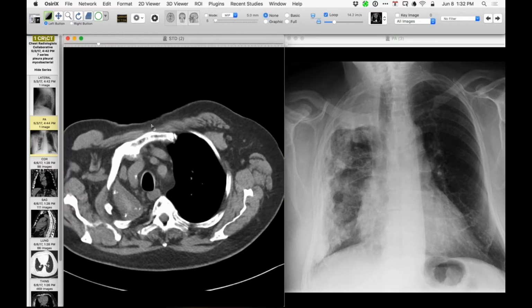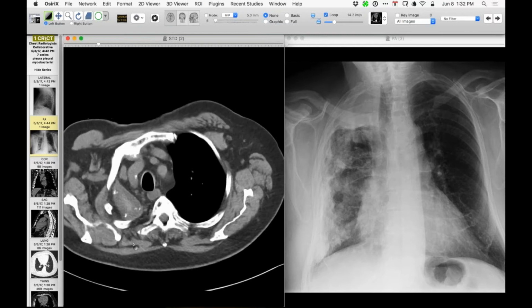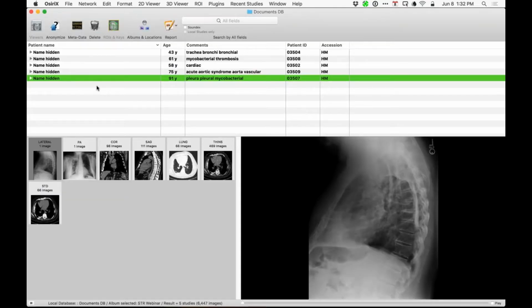Yeah. Okay, I couldn't quite understand that, but I didn't think this was ominous in any particular respect. I thought it was all part of that. No, and it's so well defined, it does look as if it's extrapleural. Yeah, it may well be. Sharp boundary, like that. So kind of a curiosity in a way, but a very dramatic case, at least for those of us in the US, of calcified fibrothorax.